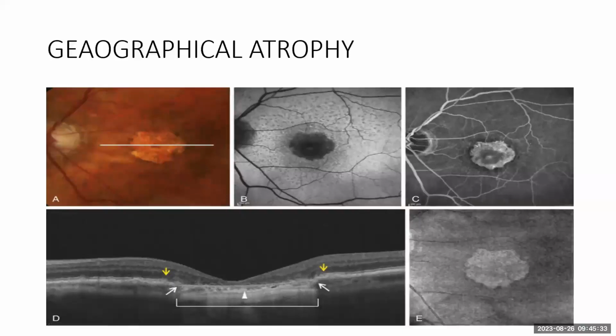Shadowing is that if you keep a tall person in front of a short person and take a picture, you won't see the short person. Reverse is that, oh, instead of the area being covered and dark, it's now excessively shiny. It's shiny because the laser light penetrates deeper than it should because the RPE is thinned out and the other layers below it are thinned out.